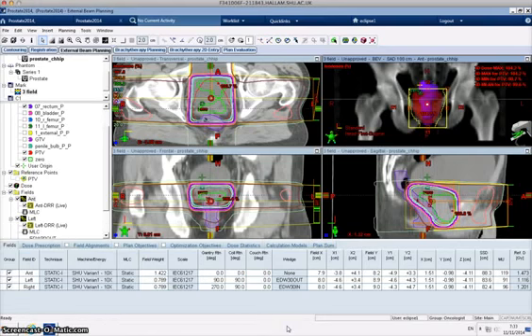So what we're going to have a look at now is using the dose volume histogram to determine whether our plan's in tolerance. So we already know from reviewing the isodoses that this plan isn't, and as I said on the previous video, what we would do is go away and sort that out. I'm not going to do that on this video because I don't necessarily want to have a clinically acceptable plan, because I want to leave you something to have a think about.